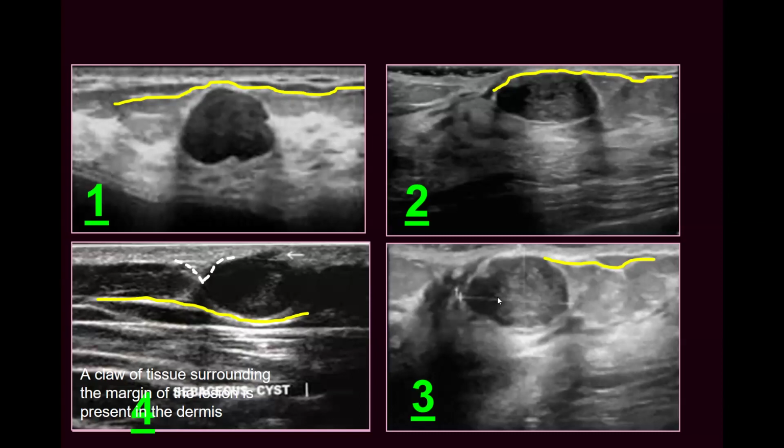This and this and this. If you look at this lesion, the superficial fascia comes anterior to these lesions. Again, for that one, the superficial fascia. And here, though it is interrupted, it is at least not pushed. You see, it goes toward the anterior surface of the lesion.